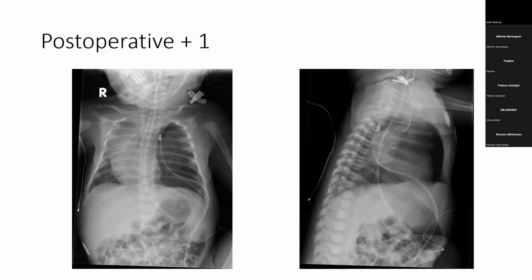So if I describe my thoughts, it'll be very interesting to see what others think, because we've got a huge group of very experienced people. Experience says that that area over there looks like you've got an element of lung, because there are markings, and then it's very lucent, definitely in this entire area up over here.